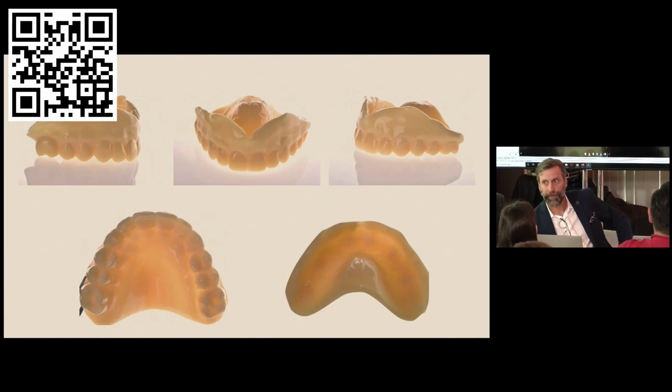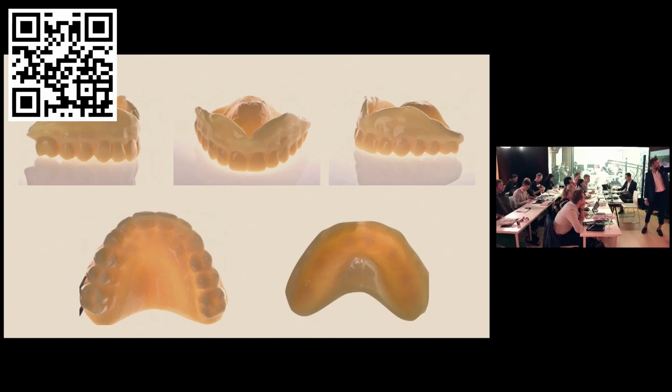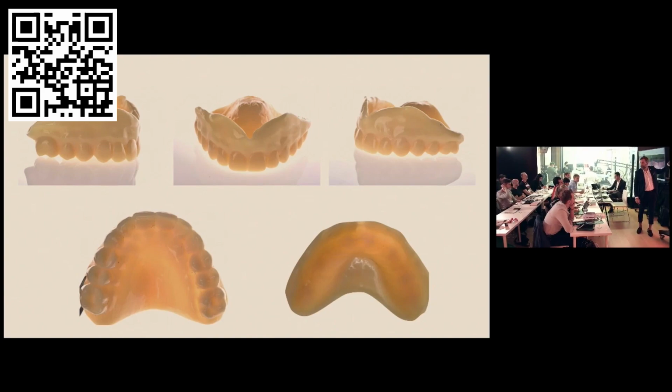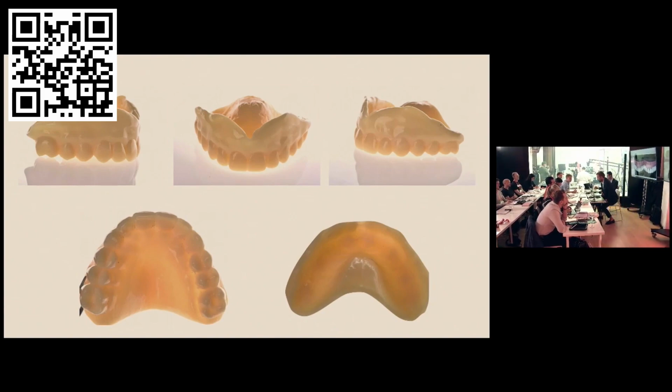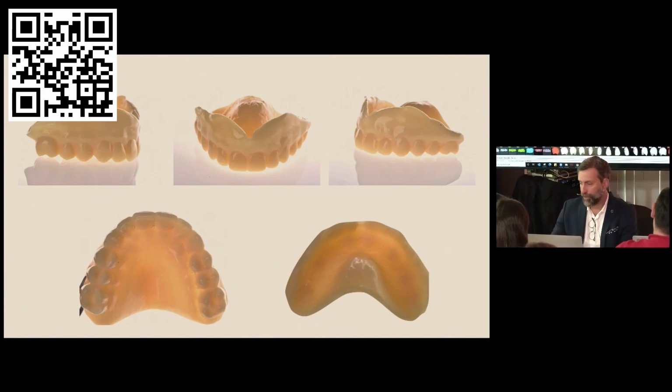So the flange, the pink part. This part here that you see here is from her old denture. It's a copy of her old denture here. And we only changed the teeth. So we trim the part where the teeth are, and we keep the pink part. Okay, and this is an STL, and you can print in tooth color material. You don't even need to add pink. If you want, you can add a little bit just to simulate the papillas, but here it's not the most important.